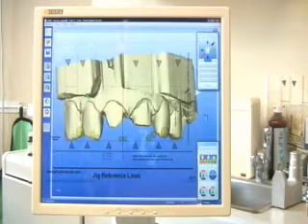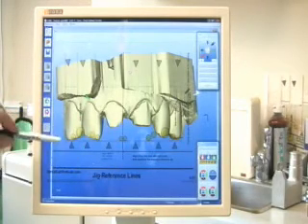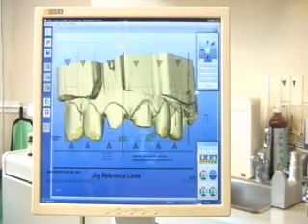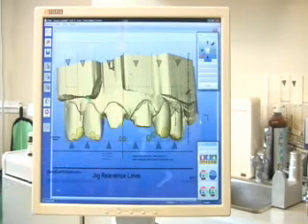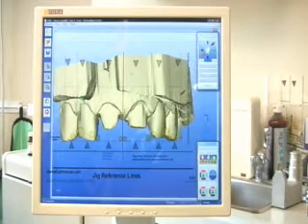The goal of the anterior overlay is to give us the ability to transfer some of the reference marks and landmarks that we use in our traditional rehabilitations to the CAD/CAM system. The interpupillary line is important since it is the basis of correct incisal angle, incisal length, and it will minimize the chance that we'll have a midline cant with the final restorations.